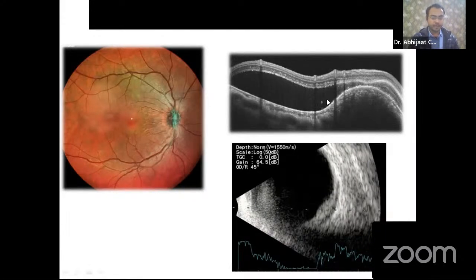And on doing the OCT image, we see that there is choroidal thickening with optic disc edema might be there, and if it is there, it can be seen if the section is taken via the optic nerve. And there's presence of subretinal fluid also, and the RPE layer shows a blade-like changes pattern.